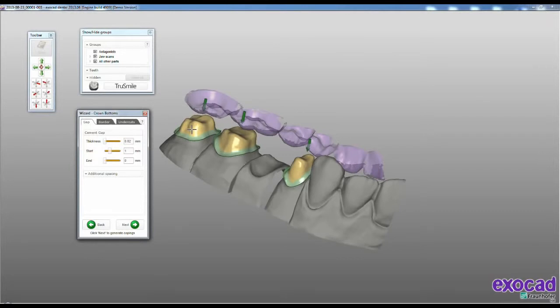And the yellow area means there's 20 micron thickness for cementation. And here border. You can define any number for those geometry of the boundary of the restoration. Each number means different position.